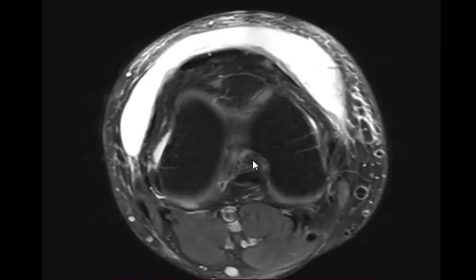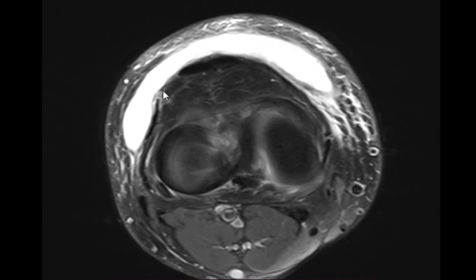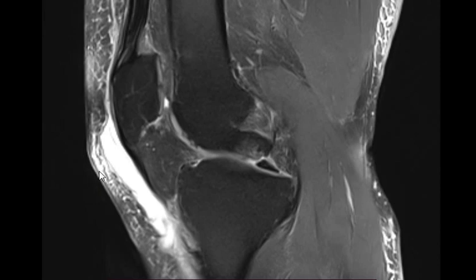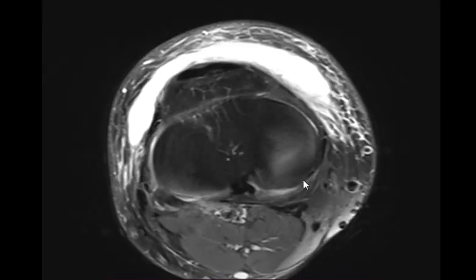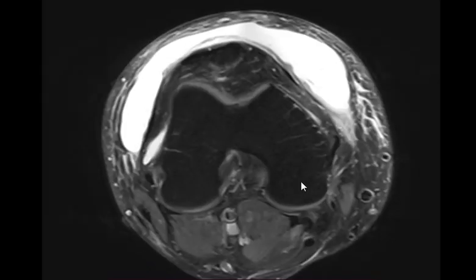This all did not catch your eye. Edema or fluid? There is a difference between edema and fluid. Localized fluid. When someone punches me, I'll have edema. But this is a fluid, subcutaneous. This is subcutaneous edema. Exactly, this is localized fluid. In the axial, what's the distribution of this fluid? It's almost circumferential, separating the skin and subcutaneous tissues from the joint.